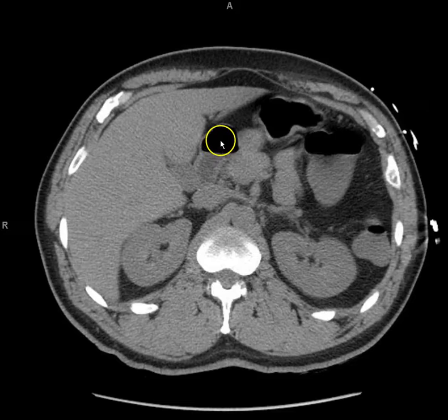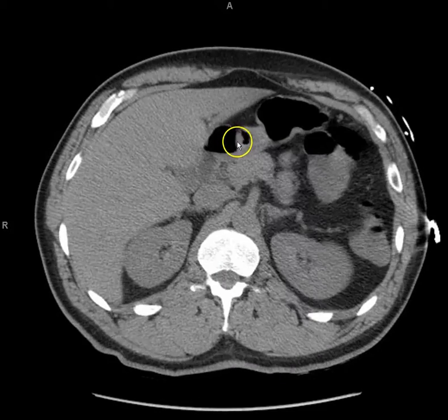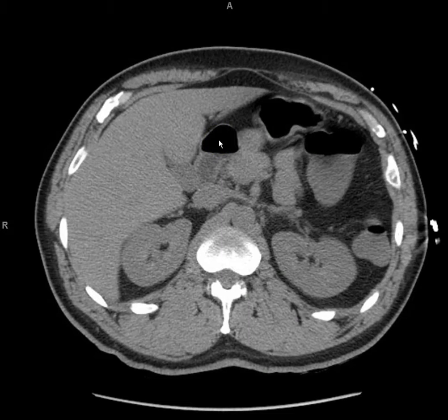And then this is the, then, which portion? So it's pylorus, and so this is easy. The duodenum portions are numbered 1, 2, 3, 4. This is the first portion. Because the surgeons who name these things are really creative. Okay.